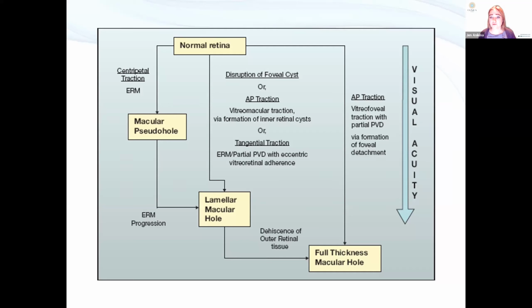If the vision keeps dropping, the problem is if they come to us, we can't do anything, not with a degenerative lamellar defect. Surgery doesn't work because it's not a full thickness macular hole. There's no tractional element. There's not much we can do, and so the referral in these cases, we're happy to check, but we're most likely to just recommend low vision. If there's an ERM component, then yes, I would see them, if only just to have a chat with the patient. The occasional one of these is amenable to surgery.